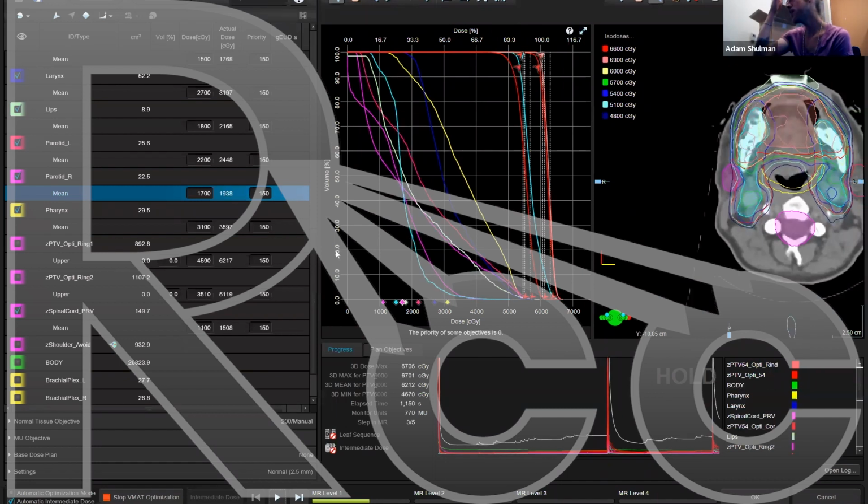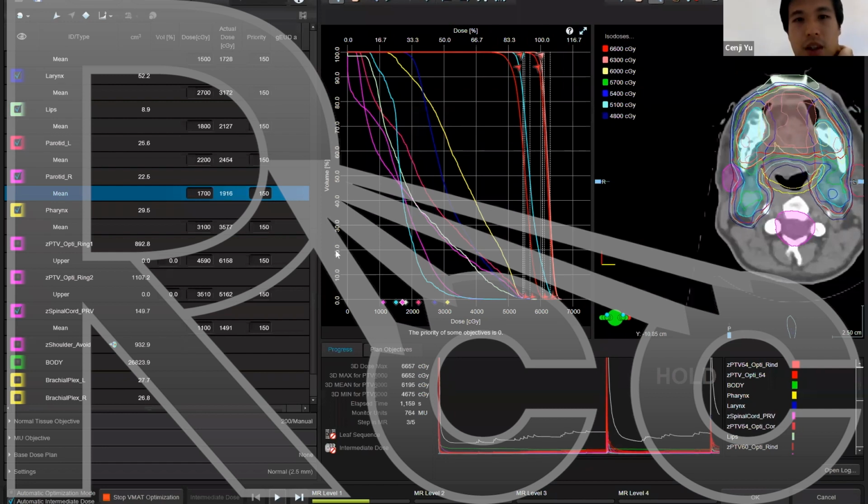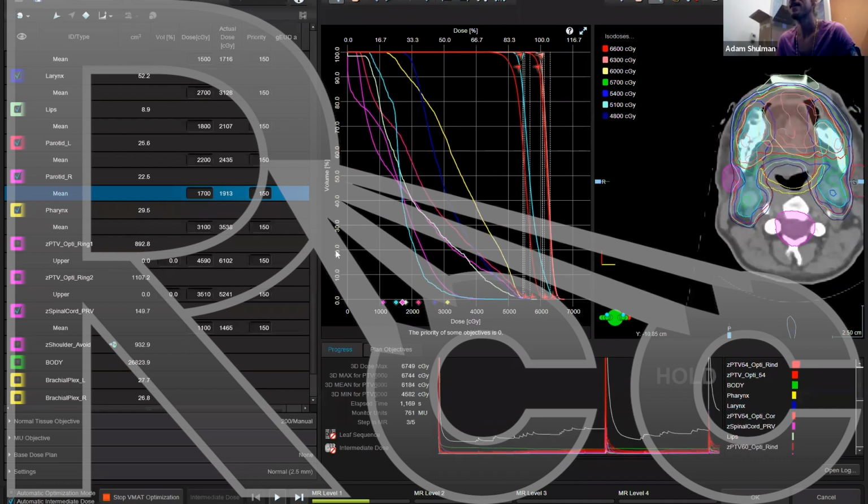Does anyone have any questions right now about anything that we've done so far? Dr. Shulman, I think there are a few questions in the chat, but it seems like some of them are referring to the previous ones. Just tell me when to stop. Okay. So the question says, can you explain how each MR level works during optimization?